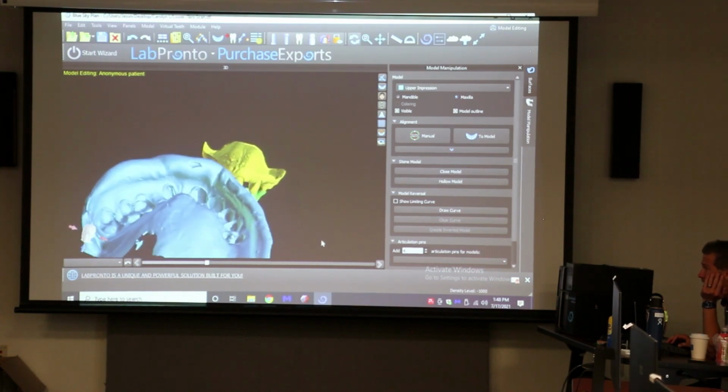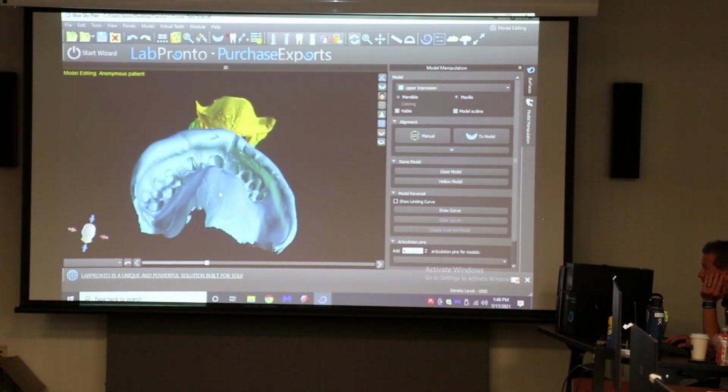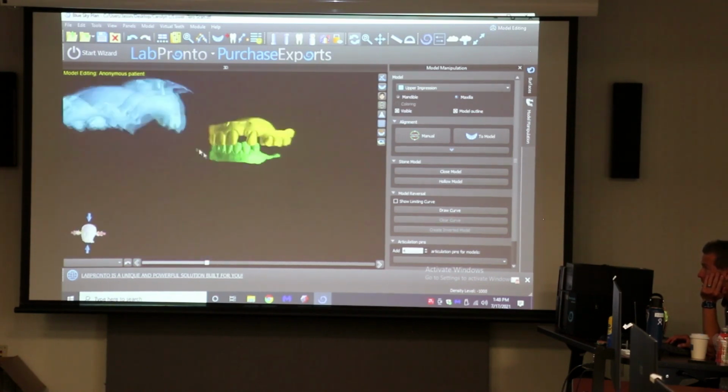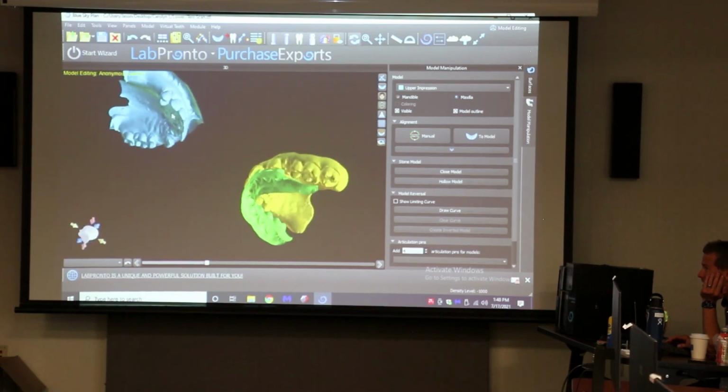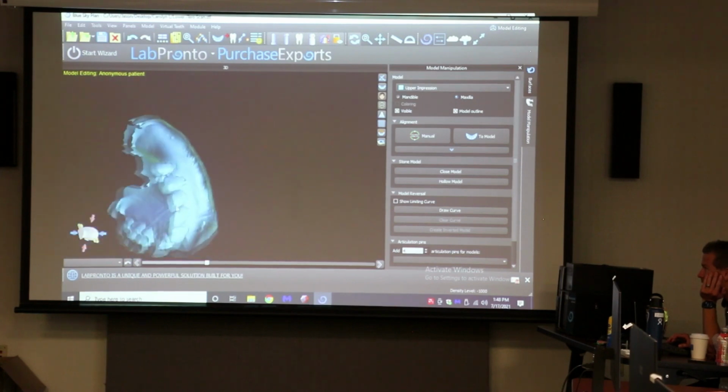I had to kind of think of it differently. Yeah, because when you look at it like this, you're like, oh, I see the impression. It's an impression. You scanned an impression. It gives you the other side of it too, all in one. It's double-sided, which is odd. Yeah, it's strange when I first saw that.